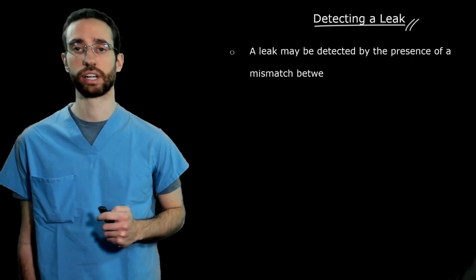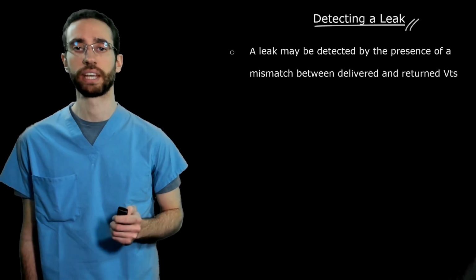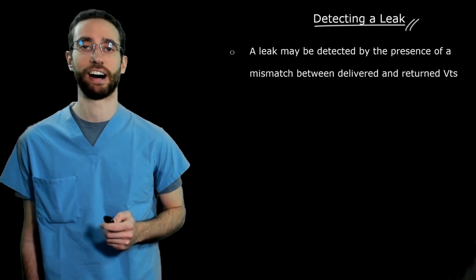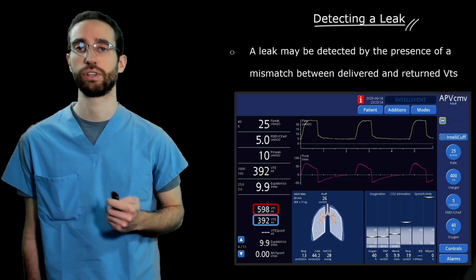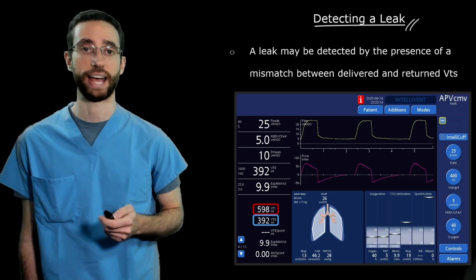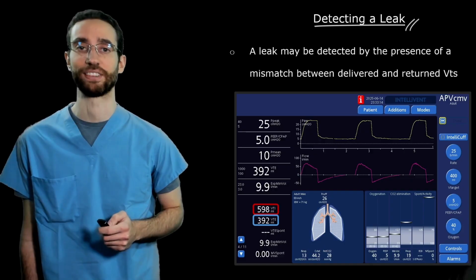One way is to look at a mismatch between delivered or inhaled and returned or exhaled tidal volumes. If there is a leak, naturally the delivered tidal volumes will be greater than the return volumes. Note how in this case, where the mainstream end-tidal CO2 sensor was loosely connected to the circuit, inhaled or delivered volumes in red are 600 mL, but returned or exhaled volumes in blue are only 400 mL.